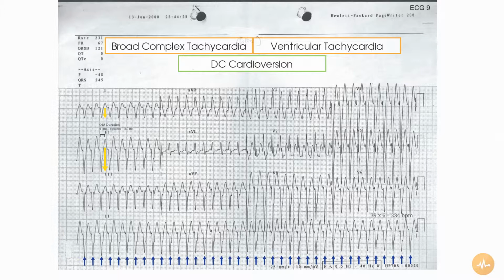the chest lead complexes point upwards in leads V1 and 2 and downwards in all the others. This non-concordance is felt to go against ventricular tachycardia in many ECGs, but on balance this probably represents ventricular tachycardia all the same. This sort of differentiation should be left to expert cardiologists and not something to be attempted when a sick patient is in front of you.